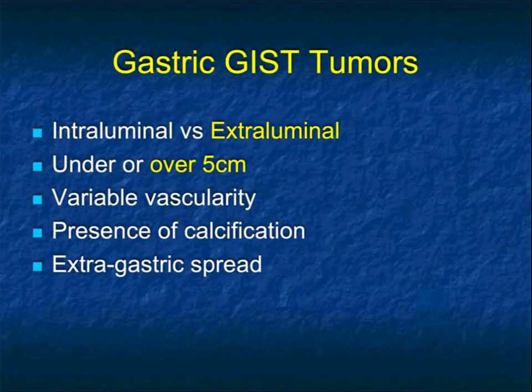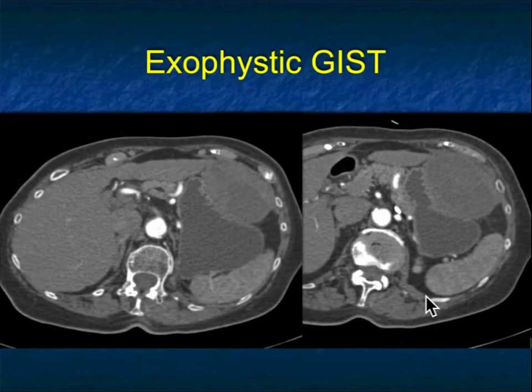And I left off last time mentioning extraluminal lesions, that these are typically the largest lesions. And so let's look at a number of them. And I want to show you many variable appearances because these are the ones that are often confused.